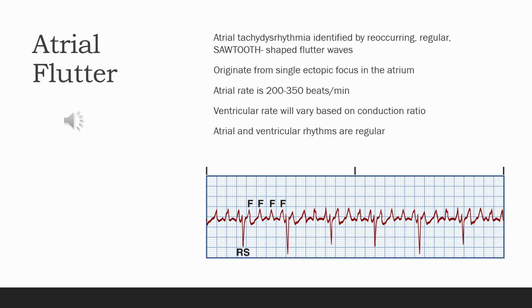So then with the QRS complex, typically this is going to be normal because the conduction through the ventricles is typically going to be unaffected.